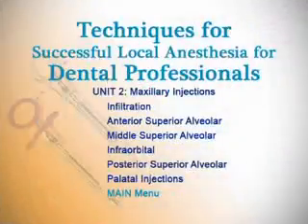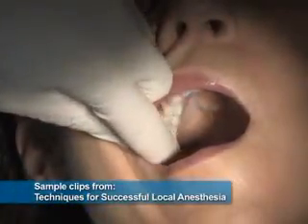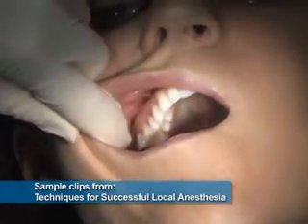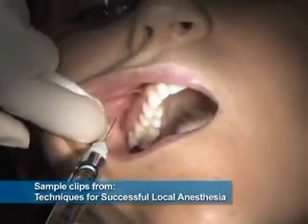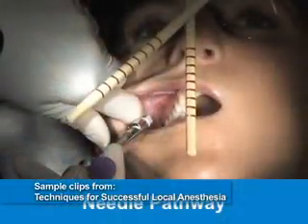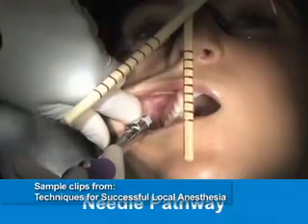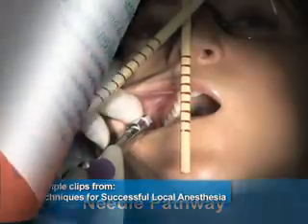It is further divided into maxillary and palatal injections, Unit 2. The posterior superior alveolar, or PSA, is a nerve block injection that anesthetizes the pulpal and osseous tissues, periodontal ligaments, buccal gingiva, and adjacent vestibular mucosa of the first, second, and third maxillary molars. The pathway of the needle is at a 45-degree angle to the occlusal plane and a 45-degree angle to the mid-sagittal plane of the maxillary molars.